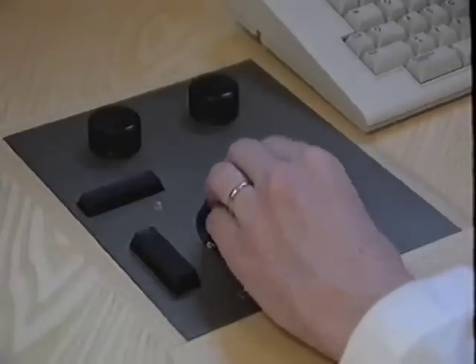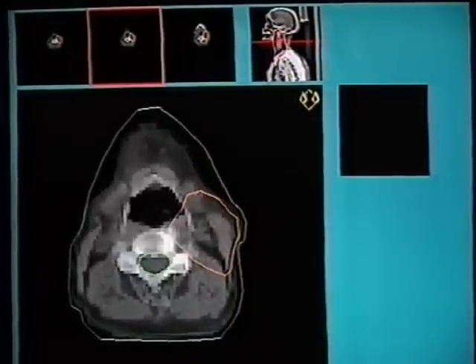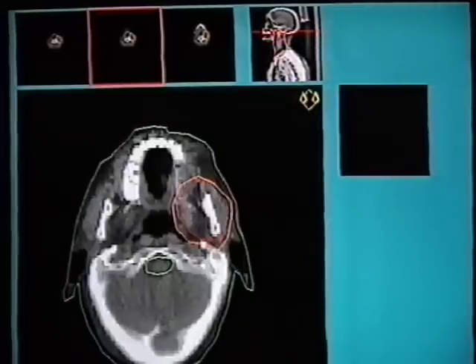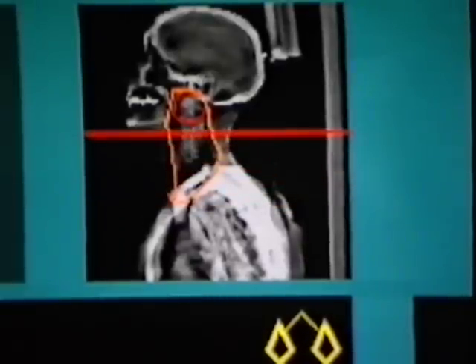Before applying radiation beams, the patient and selected inner organs are automatically outlined in selected slices. A special slice indicator gives the operator clear information on the localization of the current slice.